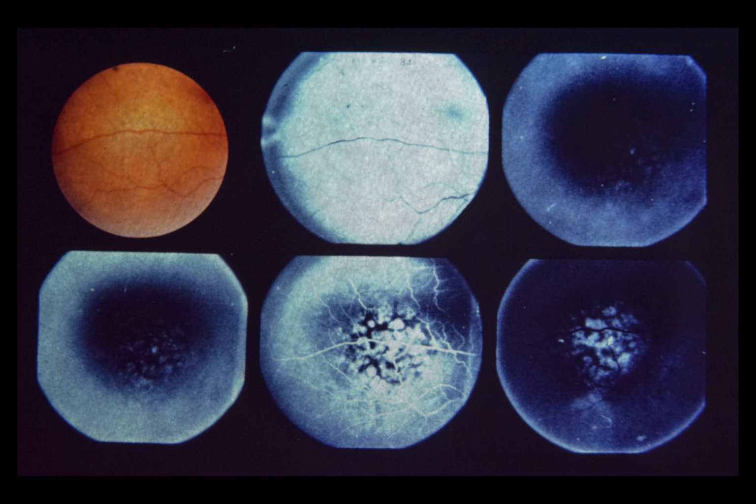Lower center, 21 seconds after injection, retinal circulation is now completely filled and there is beginning dye leakage from the choroidal lesion. Lower right, 1 hour following dye injection, note complete absence of dye from retinal circulation, but leakage of dye from the choroidal lesion into the subretinal space and retina.